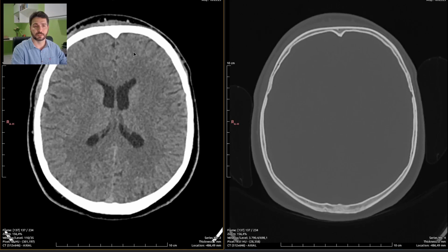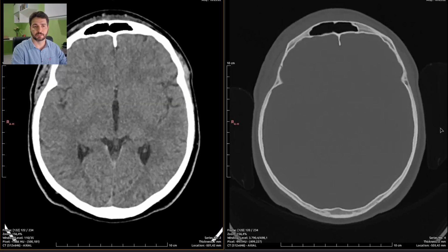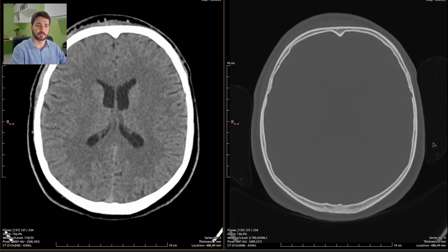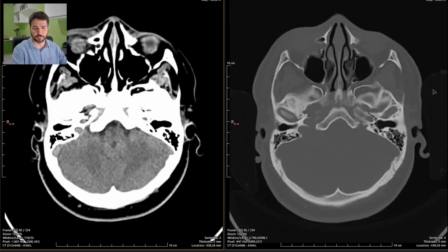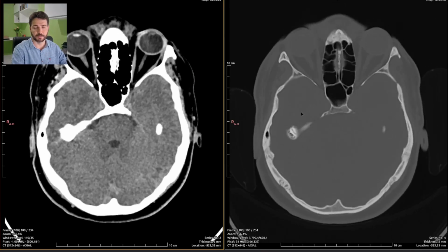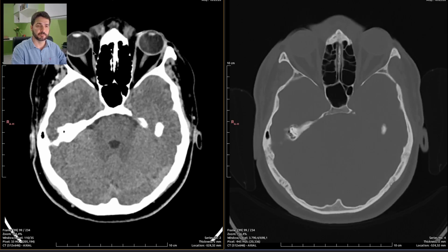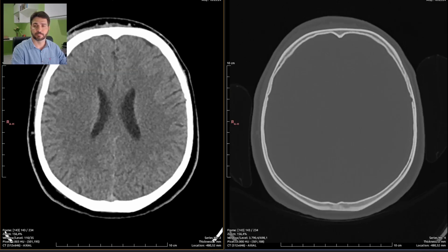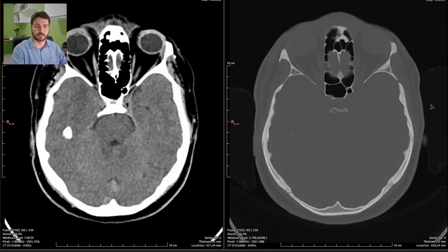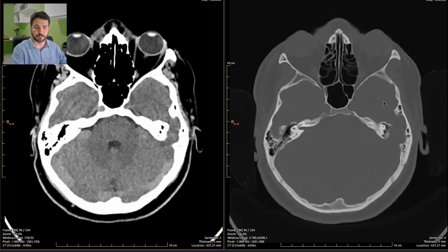I suppose this is some kind of residual hematoma, but very mild disease, very unlikely to be the motive of this scan 4 days after the accident took place. And this might be what the referring physician wrote about a black eye. This patient clearly has a facial hematoma on the right, but this isn't a sign of skull base fracture, as we have ruled out already.